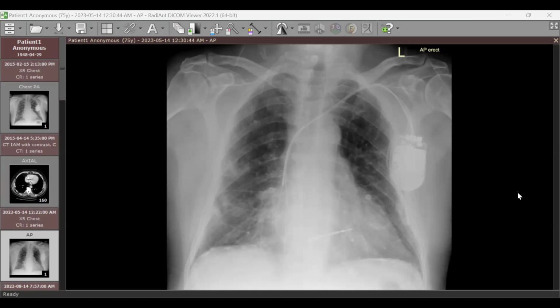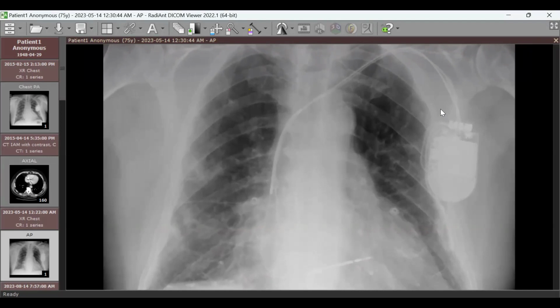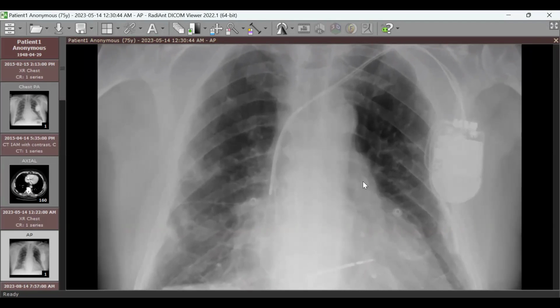Sorry, I have to interrupt you. Is this maybe a pacemaker or another device? We have many devices implanted in this position. Maybe an implantable cardiac defibrillator having two leads. Can we differentiate an ICD from a pacemaker? Yes, I think from the exact wires and the attachment to the apparatus.